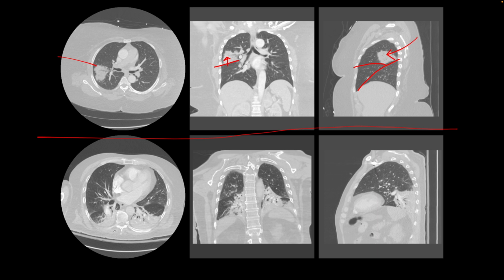The next patient, the images below show bibasilar atelectasis, where there is collapse, and because of the collapse there is crowding of the airways and the vessels, and we see the volume loss. The lower lobes look smaller, especially here on this side. And so atelectasis is characterized by collapse, and consolidation is opacification, which does not show lung collapse.